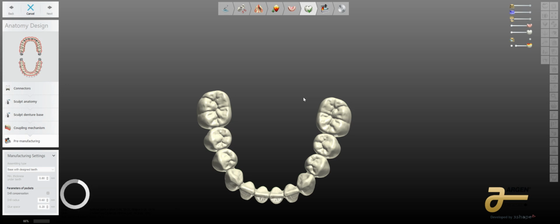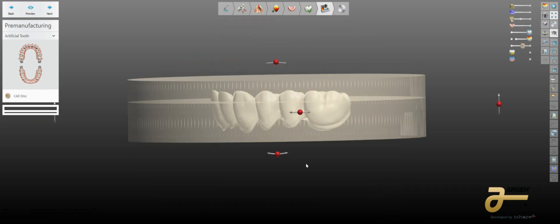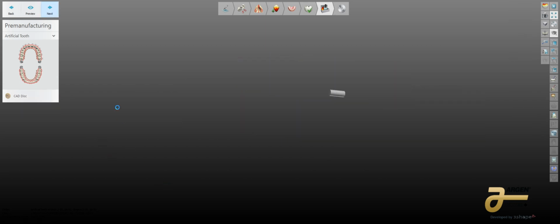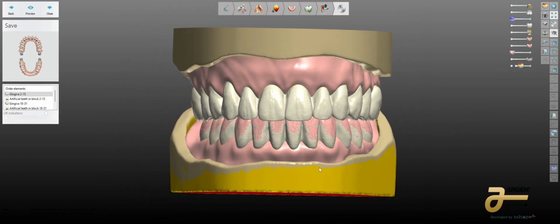And it has solved some really fun challenges. And I was really careful about what I showed, because I'm not sure if they want to do a flagship. And if you're using the Ivoclar workflow, it's going to nest it in the disk for you. And you can always change that later. But let's just finish this thing up. And here we go. Everything is managed.